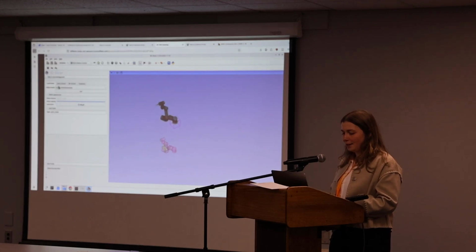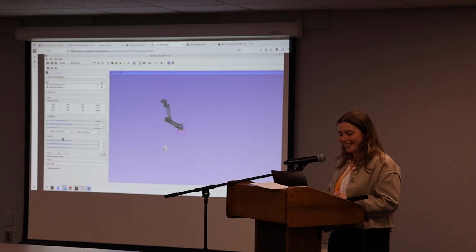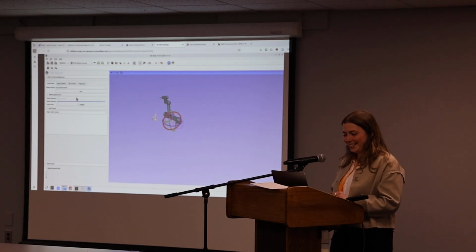Maybe I can start with a new robot if I delete. No, I don't want to delete that one. Maybe if I can select this and then use. Okay, I have a new ghost. Now my anatomy's in a different spot, so I'm going to quickly move it back. Doing this again. I mean, we have lots to report back to Kaido in terms of weird behavior. But yeah, so if you go back to 3D control, that's the transform control, so we can hide it quickly.